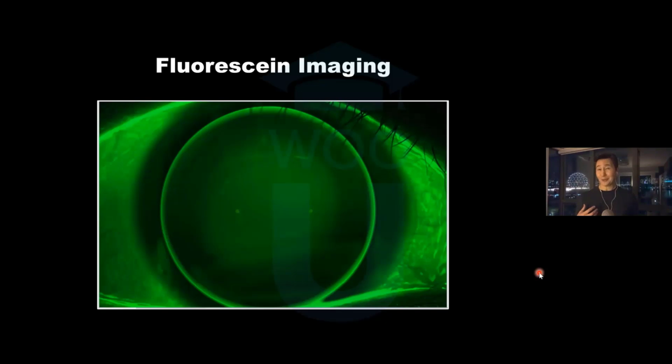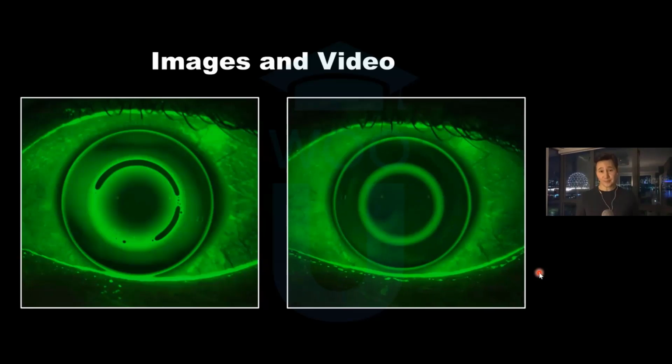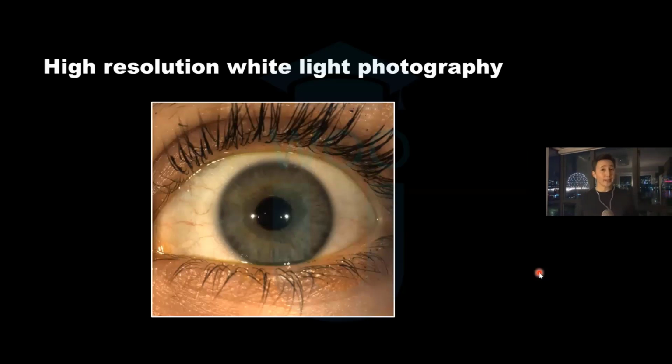That's kind of helpful, especially working with your wave consultant, because you could take that image and export it to the wave team, and they can assess the pattern with you. You also have the ability to take videos of the lens and again, to share that with the wave team, so that's valuable. You can do white light anterior segment assessment.